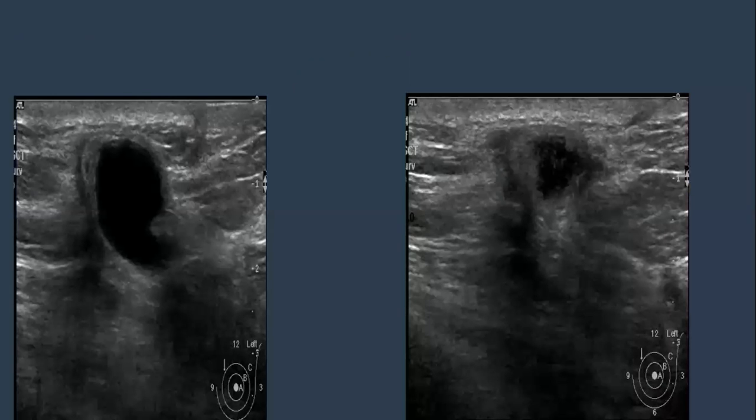This is ultrasound. These two studies of ultrasound, what do you suspect? Which one is early and which one is recurrent? The left one representing an early ultrasound. Excellent. Because yes, this is the earlier on the left and the current on the right.